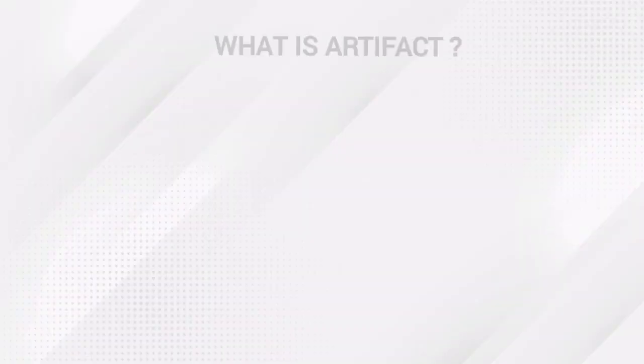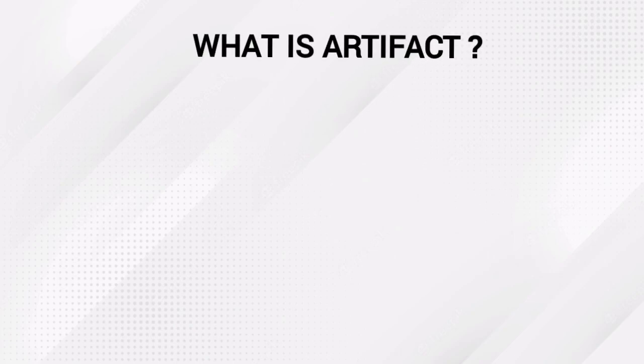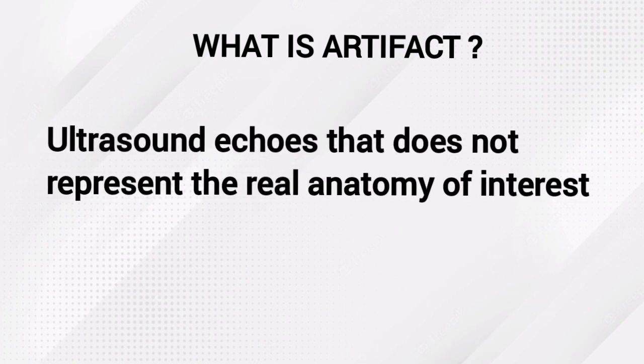Now, what is an artifact? What does the term mean? Ultrasound imaging artifacts are echoes on a display that do not represent the real anatomy that is being imaged. Ultrasound images are commonly filled with different types of artifacts and can be particularly troublesome in ultrasonography.